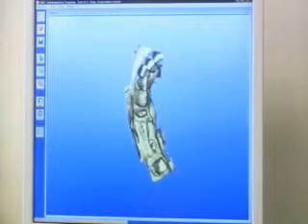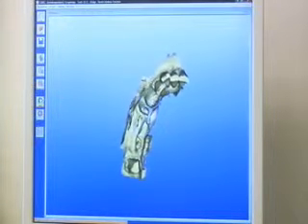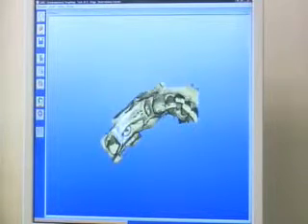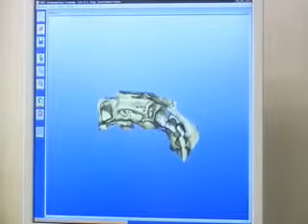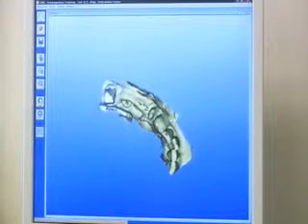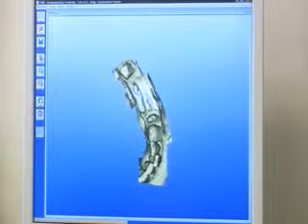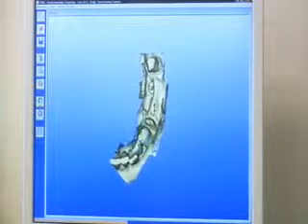With the software, you will start with your distal abutment and we'll start laying down your proposals moving forward. Sometimes what happens is the proportion of the first proposal is off and every succeeding proposal is off. So you'll end up with the most anterior tooth, which should be the most aesthetic tooth, coming out in a poor proportion.